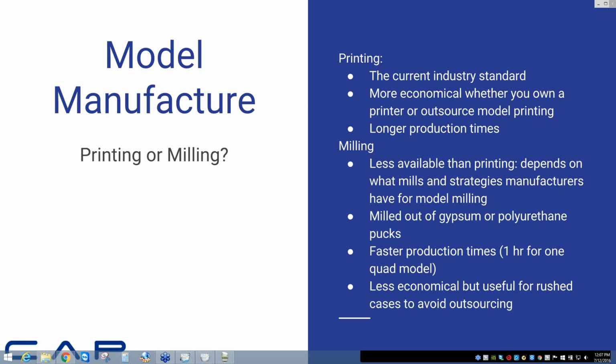I do not believe that there are any Ceramco Vertex articulators in there. There are attachments that you can make at the final sculpt step that include the Vertex ball end. So you should be able to add that to one of the articulators, but there's not one made specifically for that.